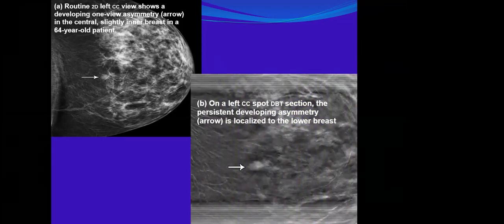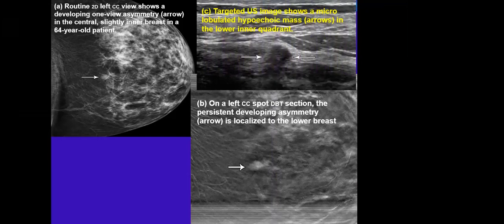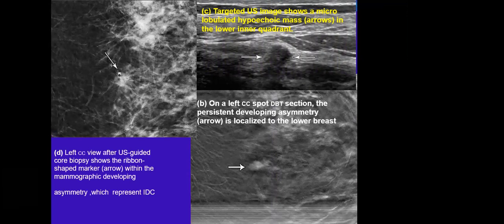Okay, not seen on ultrasound. If it is not seen on ultrasound, I need more additional help, and it is difficult on ultrasound, but we have to do ultrasound. Before ultrasound, we can do tomosynthesis. Excellent, tomosynthesis. This tomosynthesis revealed and localized the lesion. That means it is real, demonstrated as a mass. And this is the targeted ultrasound that revealed a suspicious mass.